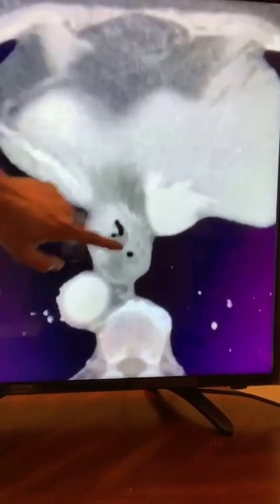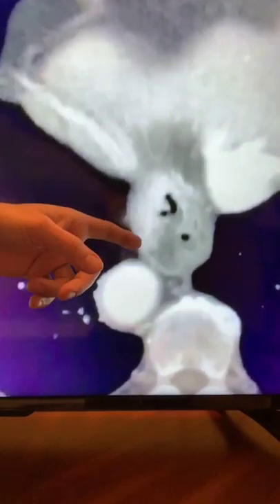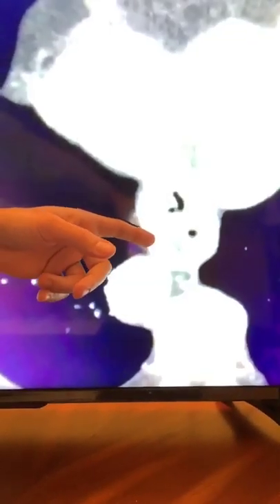You're going to see the IVC over here. Kind of the hepatic veins, they're coming into the IVC right there. You're getting a little bit of the liver. You're getting some of the diaphragm right here. These are the lungs. And then there's this guy right here, right in the middle. That's a hiatal hernia. Okay, you're going to see this commonly. A lot of people that you're reading CTs on are going to have this.